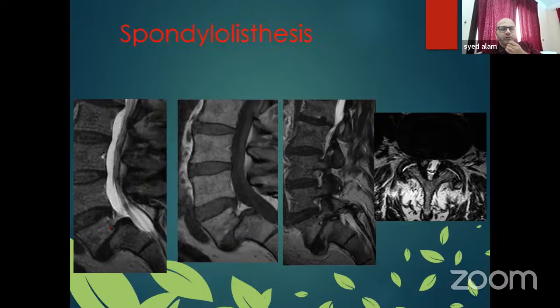Here we should have knowledge about spondylolisthesis. There was an orthopedist whose name was Meyerding, so we describe this according to the Meyerding method. So what is the Meyerding method? For spondylolisthesis, he draws a line from the end plate, then one line at 90 degrees to this at the corner of the end plate.